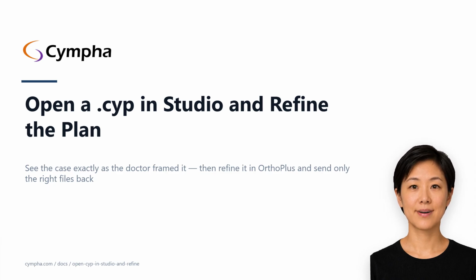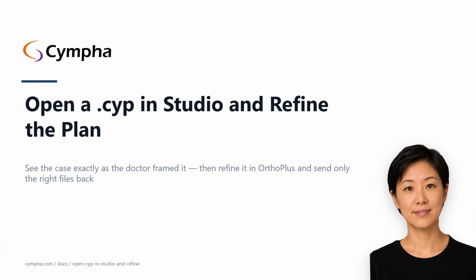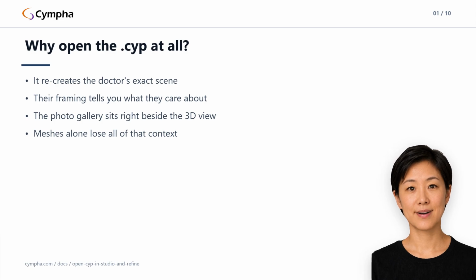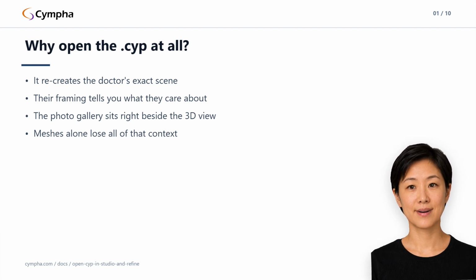Let's answer the obvious objection first. The scans are already in your folder, so why not just open the meshes and get on with it? 2 reasons. First, the doctor's framing tells you what they care about. When a case was built in Cympha Studio, the project file recreates the scene they were last looking at, and if they left the camera parked on a single midline, a posterior cant, or a third molar collision, that's the doctor pointing at the problem without writing a word. Jumping straight into OrthoPlus throws that context away.